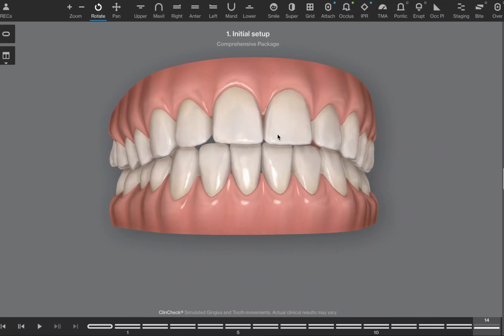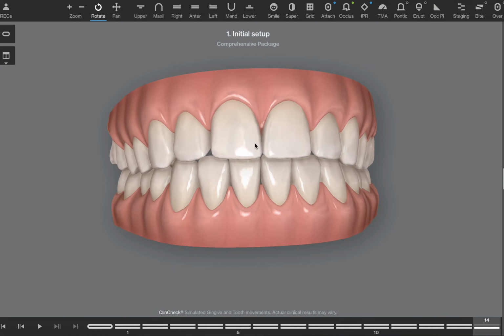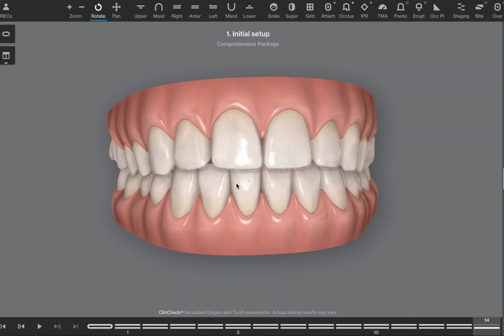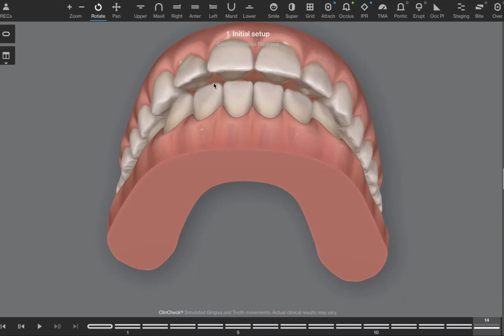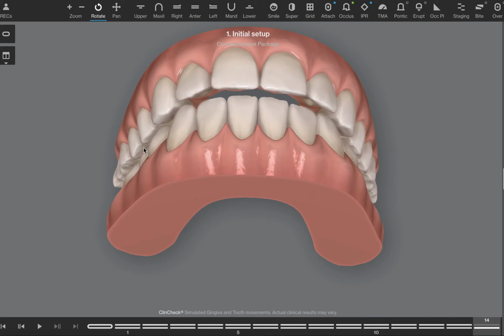To do that, I'm most likely going to have Invisalign expand your arches even more, which is going to give you an even more beautiful smile and a more functional smile, and that will help us decrease this overjet. So long story short, when we expand, meaning take the back teeth and push them towards your cheek, we improve your airway, we improve the space for your tongue. Looks more aesthetic, but it also helps to decrease this overjet. As that happens, your muscles are going to be happier, your joint is going to be happier, and we're going to track that over time.